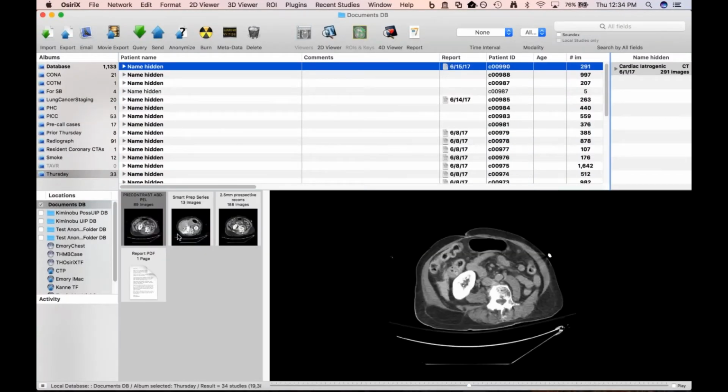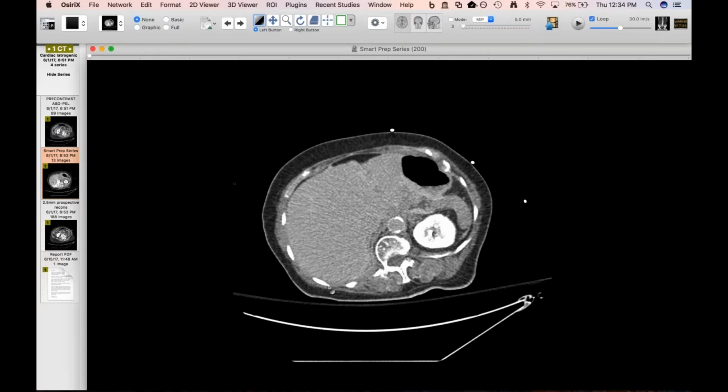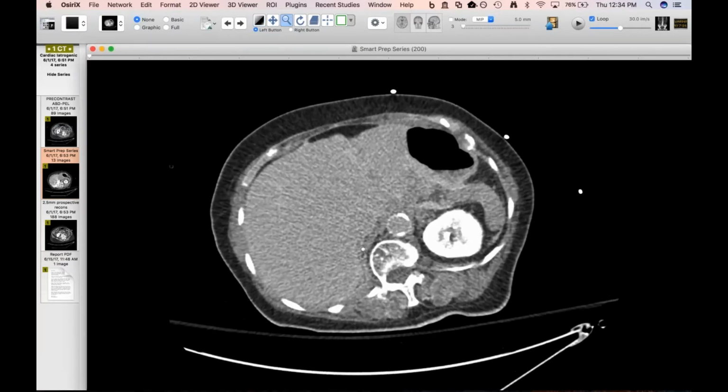That's odd. And then here, speaking of tamponade, this is an exciting case. This is an 80-something-year-old woman who underwent TAVR here on the date of this exam. So this is a few hours after her TAVR. She was doing great, went to the ICU, and then all of a sudden wasn't doing so great. Developed hypotension. And as you can see, this is an abdomen and pelvis CT. So I'm not sure exactly what went into the thought process, thinking that this must be mesenteric ischemia in somebody who had just had a procedure, but that's what they thought.